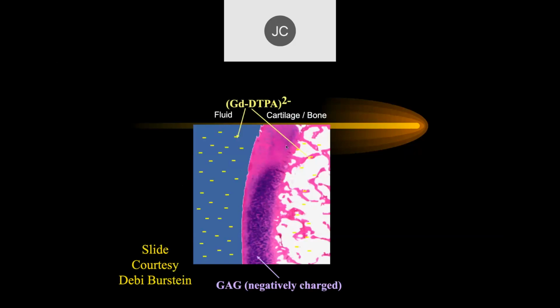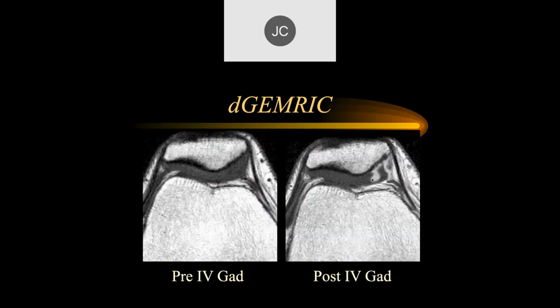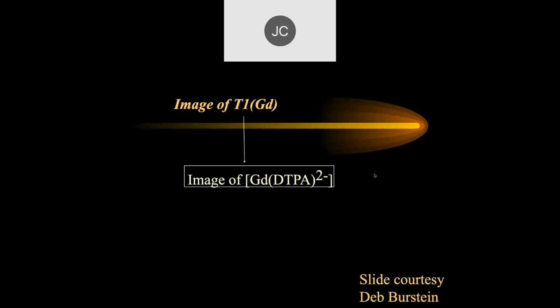And then if you put in contrast, in both the articular cartilage fluid as well as the bone itself, then the contrast will diffuse into areas where there's no glucosaminoglycans, but not into areas where there are glucosaminoglycans. So you'll get increased signal intensity on T1 weighted images in the area where you have abnormal biochemistry. So this just shows the area of abnormality we saw earlier.